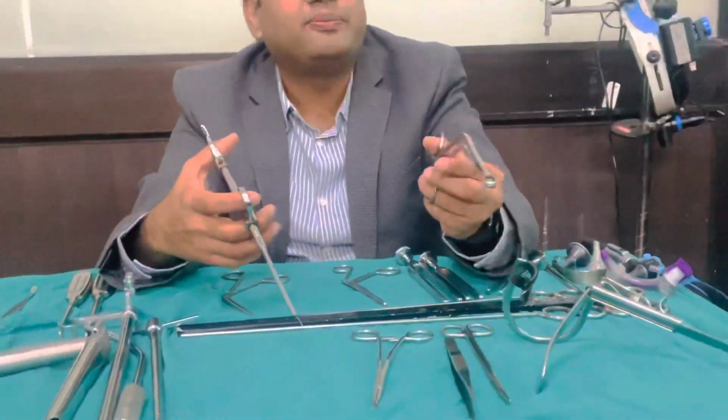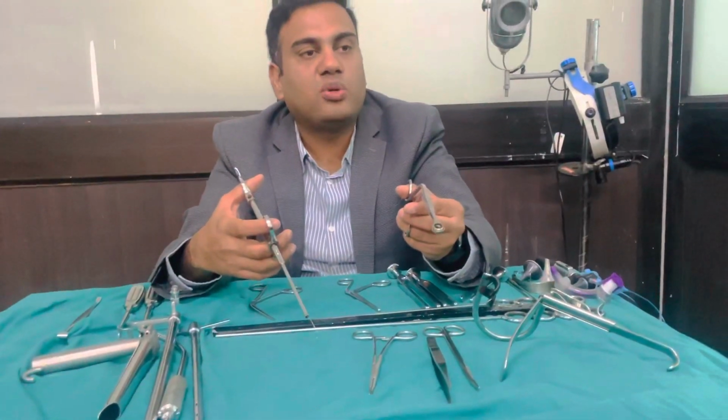Can I get a gauze piece to demonstrate to the students how we can do the tonsillectomy?